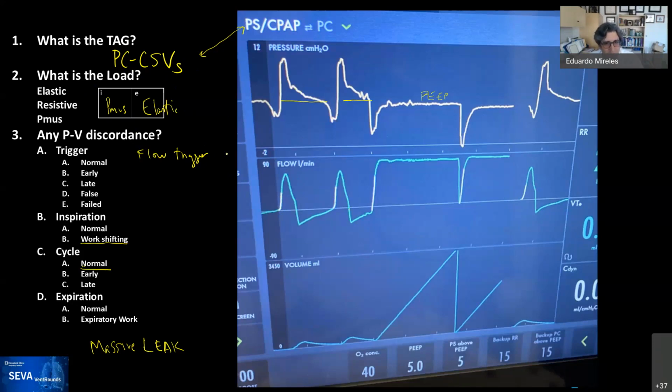And during inspiration, I think you have the benefit of this line. I know I took this picture crooked, and I apologize for that, but you can see there's always a little bit of phase shift between these things, but you can see how the pressure drops from what seems to be baseline here. And remember, this is the past, and here it continued. So here is what's happening right now. This is an old waveform, and right here there's a zone in which they are erasing everything, just so that you can read this better. So there's this line, and he's at baseline.